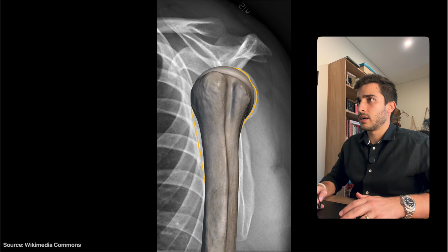We have the humerus and the scapula. And we see basically what we saw on the x-ray. And if I was to rotate the patient sort of in PA position and in position to where the scapula would be, okay, obviously we see a bit of the overlap between the scapula and the humeral head, which is kind of what you see over here, okay?